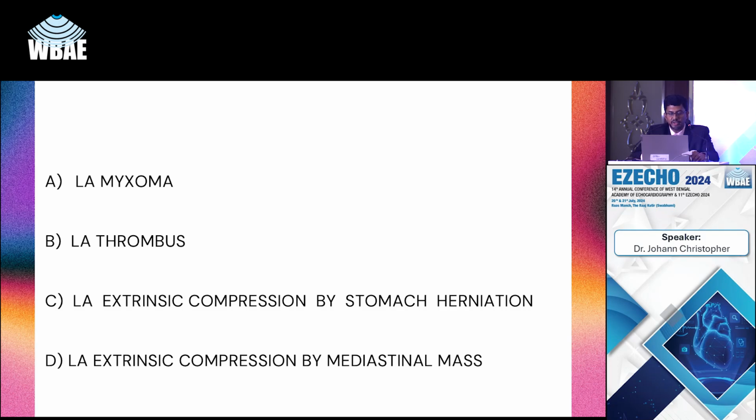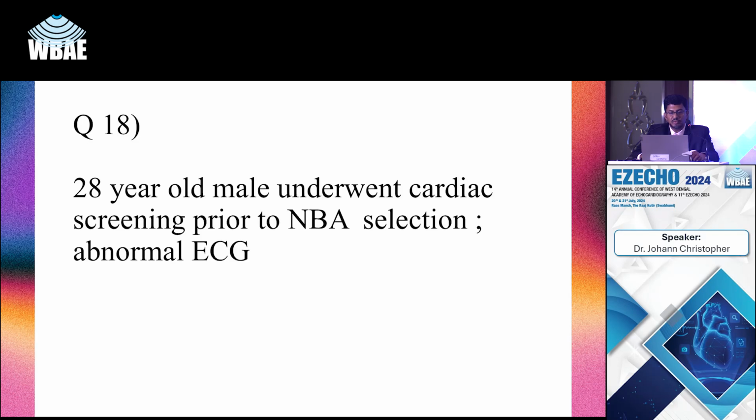The picture on the right is a T2 fat-sat image, which looks for water in the heart. It is not a scar image. Gadolinium was not given to this patient, again because of creatinine issues. So the left one was the cine that you would see in echo. The right is a T2 fat sat image.